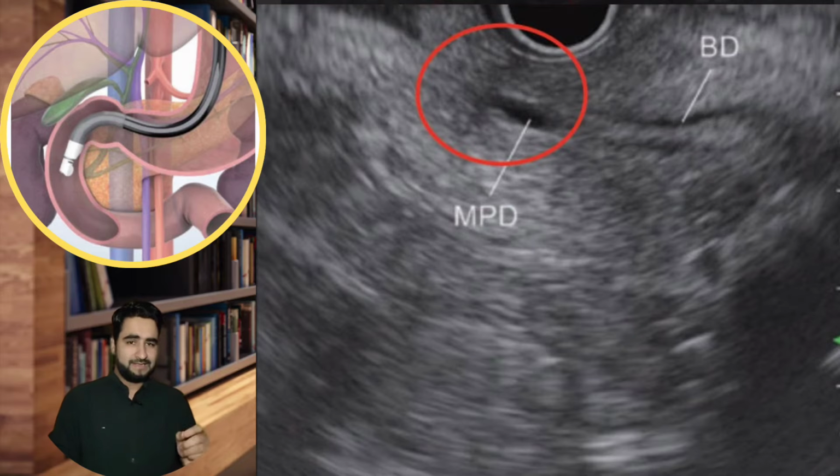If you analyze the anatomical image here, you can see these two structures are in the range of central beam and shaft beam from the transducer. That's why you can see them on the central field extending to the right side of EUS image. Remember, the shaft beams are displayed on the right side of your EUS image, while the central beam will be displayed in the center.